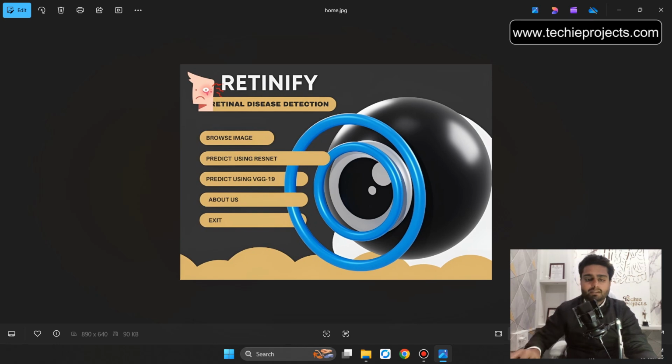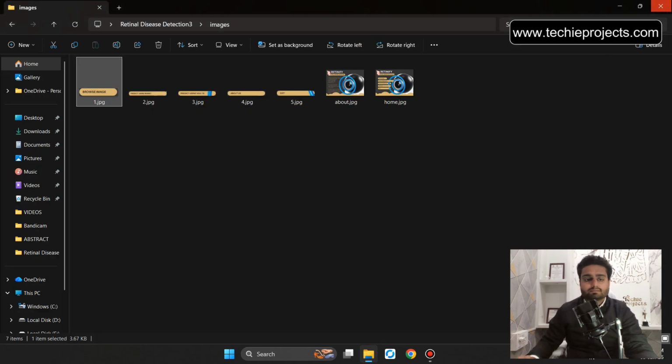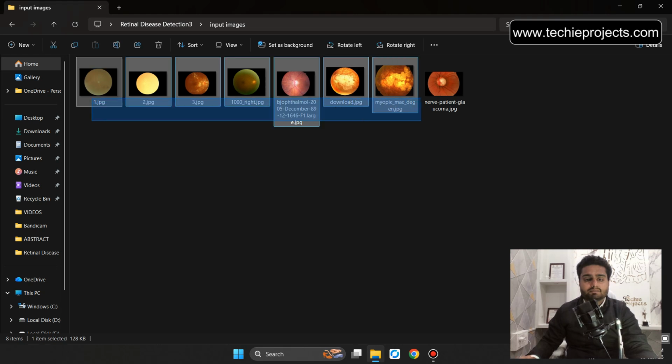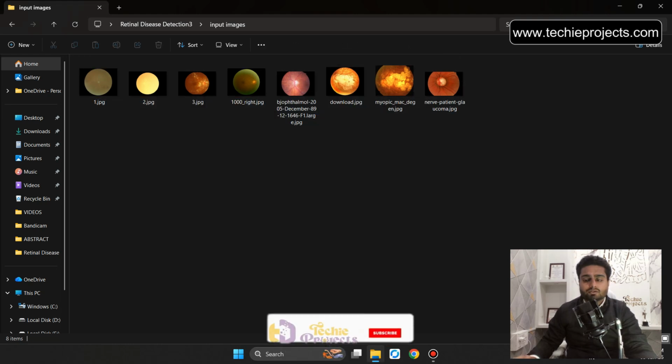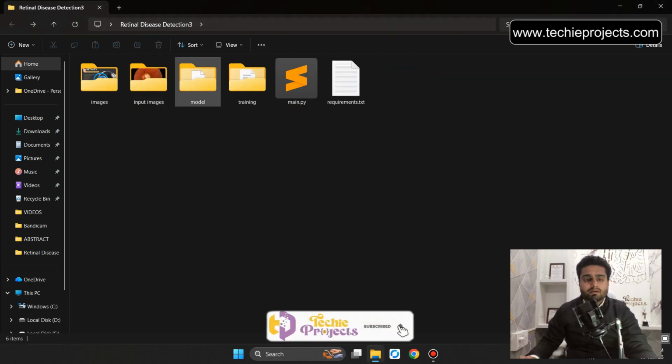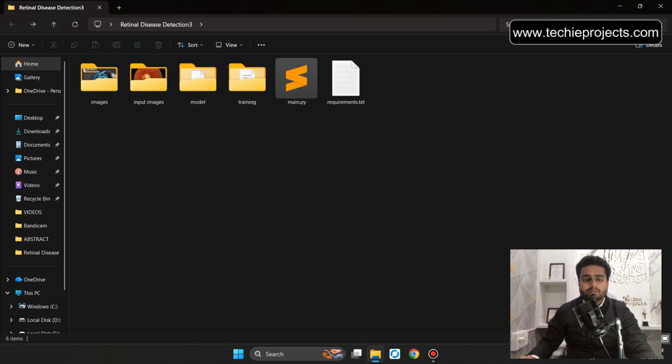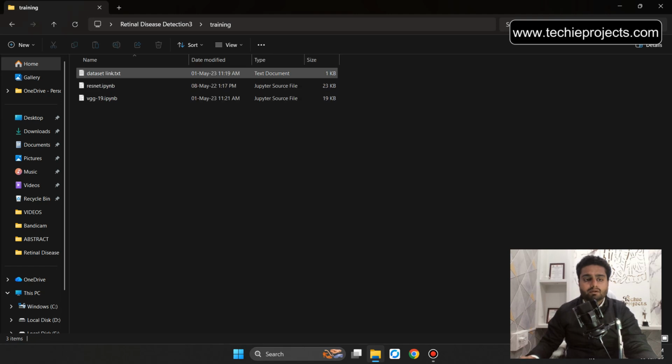Okay, this will be the home page. So let's close that. Let's go back. Now those are input images. Let's go back. This will be the model folder that contains the ResNet and VGG19 .h5 models. Let's go back. Now open the training folder.